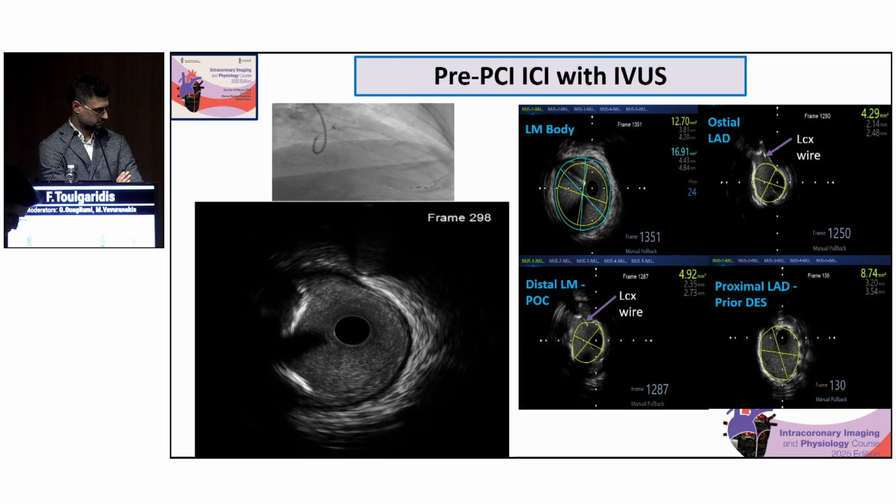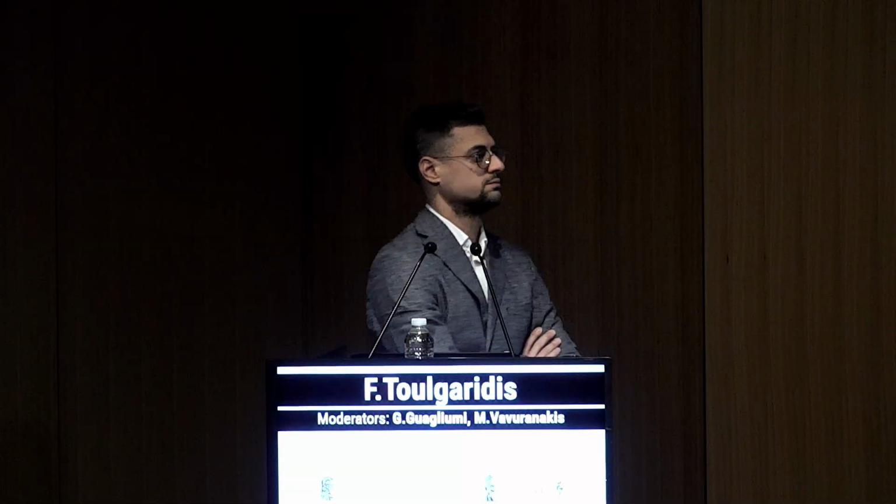So let's try to see the panel, what they are thinking about. So we got this imaging interpretation. How do you want now to proceed based upon the imaging? So what we call actionable imaging. I am Dr. Gavrielatos from Ioannina. I think now that we have knowledge about the calcium, because without the IVUS, we do not know if it is eccentric or concentric. As it was mentioned previously, it is concentric at the point that it is the largest stenosis, and also we know that there is not much calcium at the ostium of the LCX.